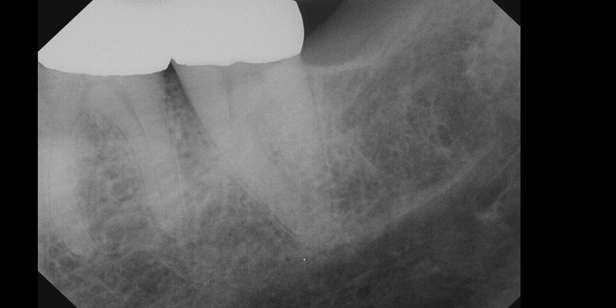So there's a clear distinction between above and below this line. So this line is the internal oblique ridge, which again, based on my CBCT experience, is typically the superior border of the submandibular gland fossa. So that's the internal oblique ridge, also known as the mylohyoid line.